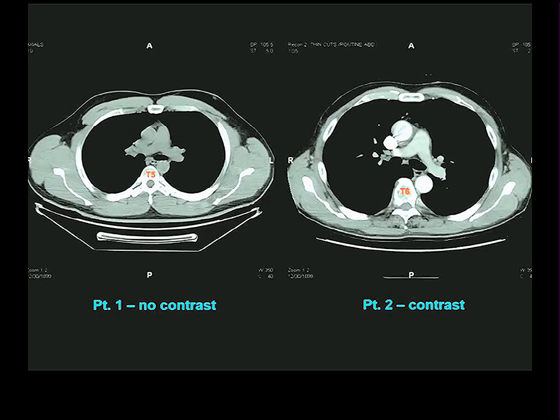You can see, we've already identified everything in this. Now, it's pulmonary trunk, right pulmonary artery, left pulmonary artery. To the right of the pulmonary trunk is the ascending aorta. To the right of the ascending aorta is the superior vena cava. Well, here the superior vena cava is brilliantly white because it is filled with radio-opaque contrast material that's been injected into a vein of the arm, which is draining into the superior vena cava. The aorta, ascending and descending, and the pulmonary trunk, they all stand out much clearer when you have contrast. So putting contrast in a person enables you to see things a lot better, but it doesn't change where they are.